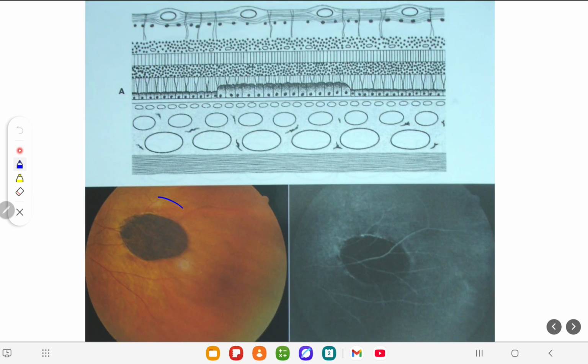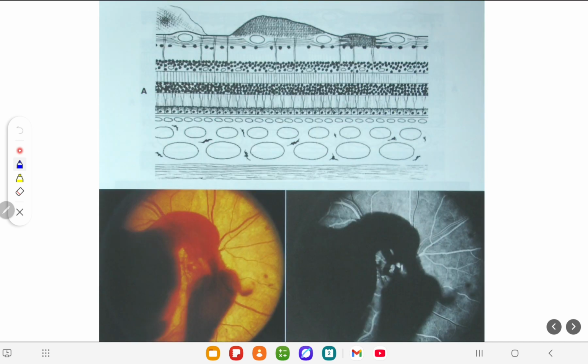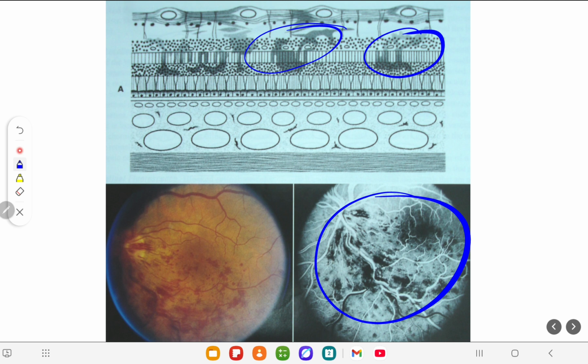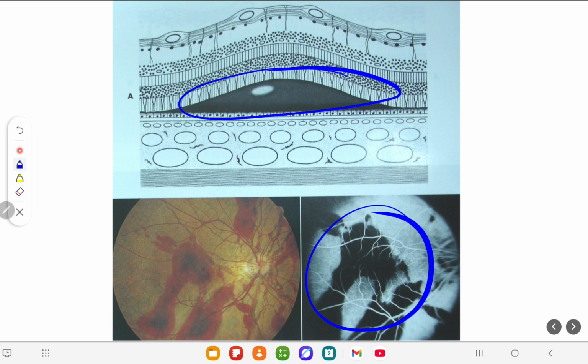In this picture, can you see this blocks the fluorescence? Hyper RPE getting larger. This is vitreous hemorrhage. Can you see this blocked fluorescence? This is blood at this place. Can you see in the retina? It blocks even the choroidal fluorescence. See this leakage of blood. Can you see this complete blockage of posterior fluorescence?